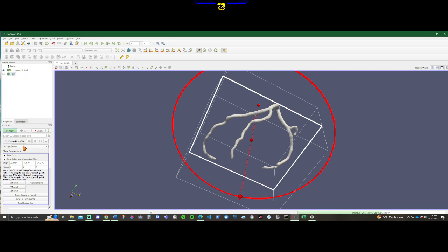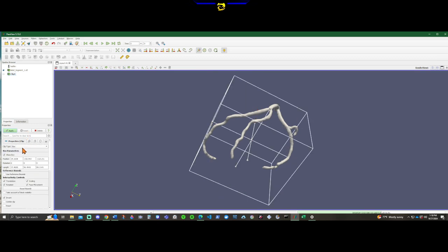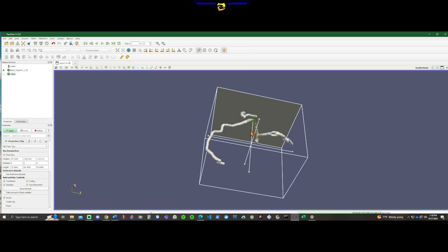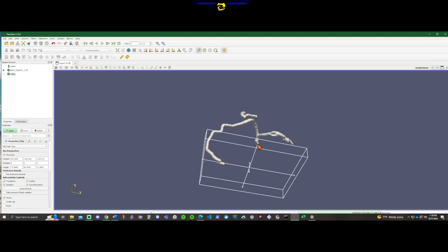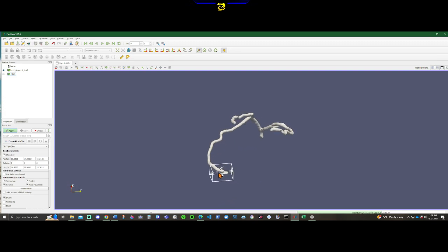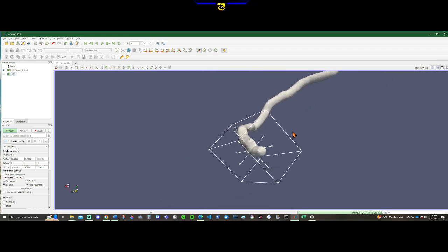But let's focus on the clip. So the biggest thing is for the clip type, you want to choose box, because every other clip type is for very symmetrical models, and what we're working with is nowhere near symmetrical. Drag this box to fit the sort of shape that you need, and then similar to 3D Slicer, use the middle click button, the middle scroller button, to drag.